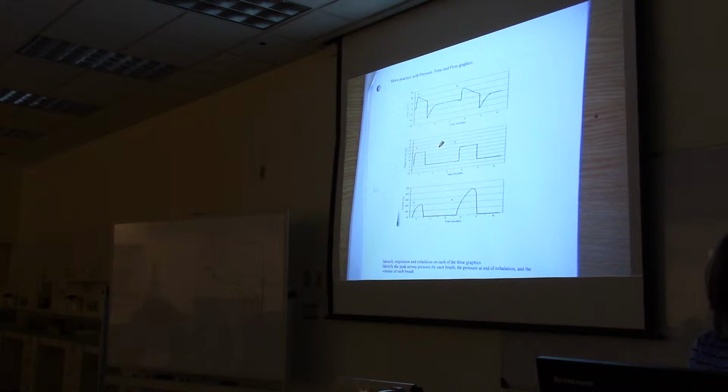All right, and then for the next one, we've got pressure building up in the lungs. So peak inspiration would be right here. And then the pressure goes down because the volume is exiting the lungs. So maybe you want to draw a big dot right here and call that your peak inspiration. And then maybe put an arrow and call this exhalation.